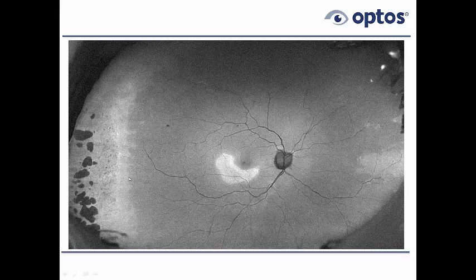We can get far peripheral abnormalities and lesions in the macula. We actually saw an optometrist that had something similar to this, and we published him. Again, central lesions and far peripheral lesions, nothing going on in the mid-periphery. That was published, I believe, in Primary Care Optometry News about 4 years ago with autofluorescence images.